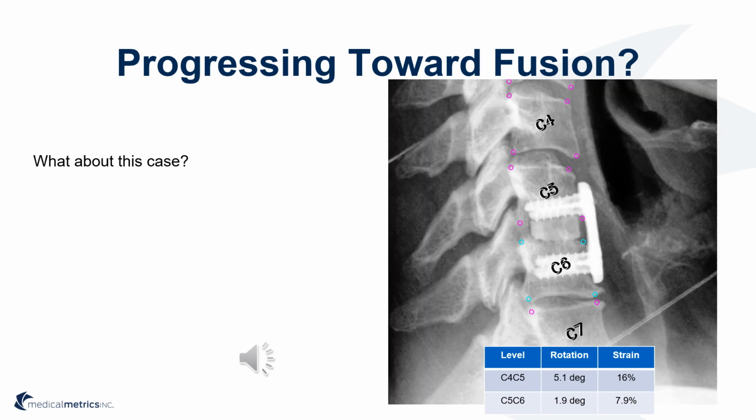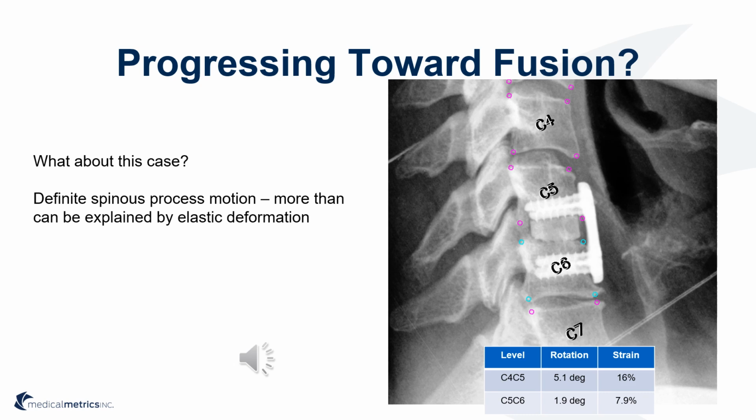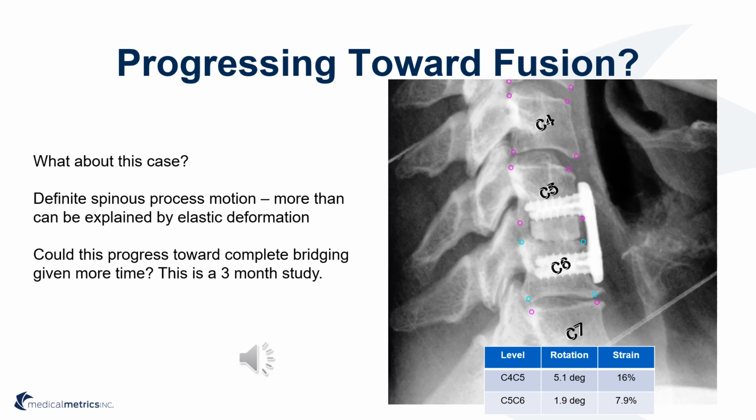What about this case? There is definite spinous process motion, more than can be explained by elastic deformation of the spinous processes. There is also interbody motion. Will this progress toward complete bridging given more time? This is a 3-month exam.